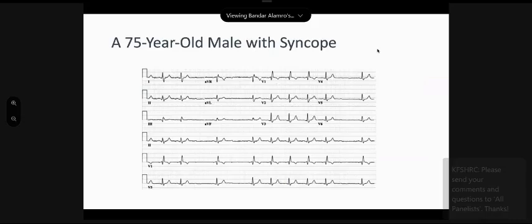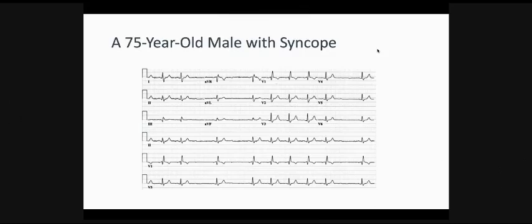Perfect. Let's go to the next one, and this is a 75-year-old gentleman with syncope. And of course, in the exam, you will have a short statement or a short stem about the ECG that you will see.